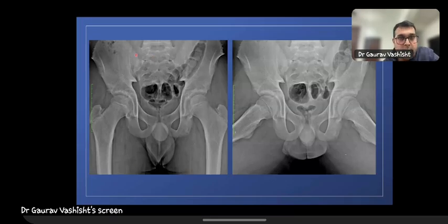So this is a frontal radiograph of the pelvis with both hips. Again, a skeletally immature patient. The growth plates haven't fused as yet. The irregularity along the iliac blades, these are the normal apophyseal appearances. This is not pathological.